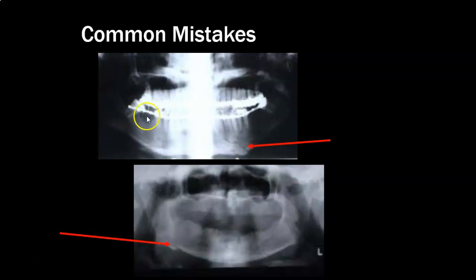The other clue is there's a whole bunch of stuff happening around here. They've got some crazy ortho or something going on. So maybe they broke their jaw on purpose, or I don't know. Sometimes they have that surgery where they break and reposition, but I don't know. That could just be from trauma.